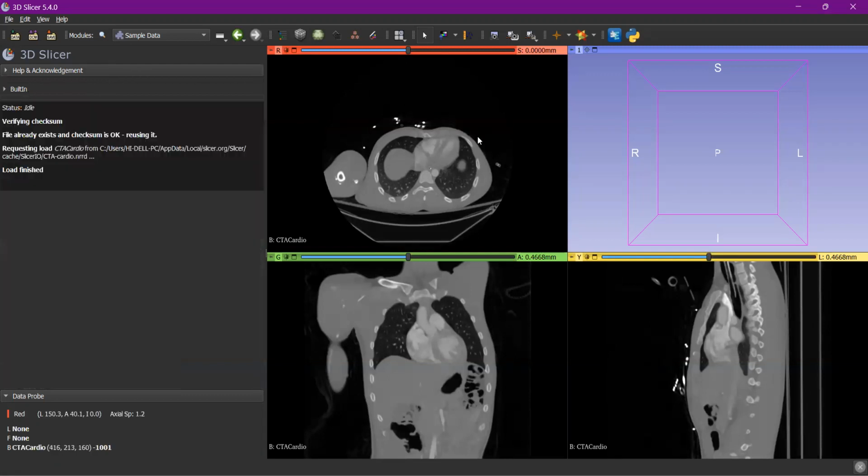The main thing I'm going to explain is the segmentation of a bone. In this recording, I may not complete the whole segmentation because it takes much time to explain every detail in every slice, so I'm going to give an overview of everything.